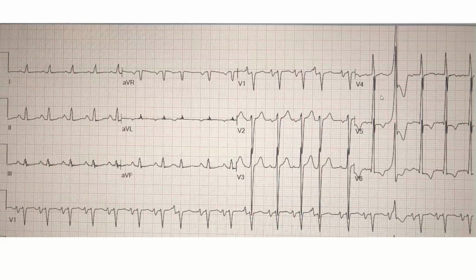So know that idea. Huge QRS voltage in the precordial leads, mainly the Sokolow-Lyon, S in V1 or V2 plus R in V5 or V6 more than 35 millimeters. That's what was used by Goldberger. While QRS in the limb leads is less than 8 millimeters, it is suggestive of a cardiomyopathy with low EF pattern. The cardiomyopathy could be ischemic or non-ischemic. That feature also may apply in patients with or without left bundle branch block.